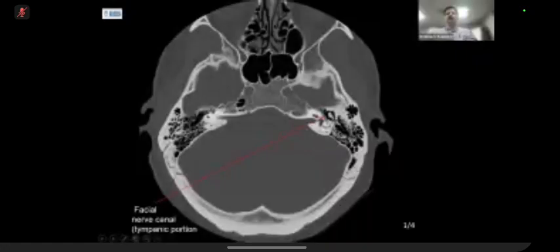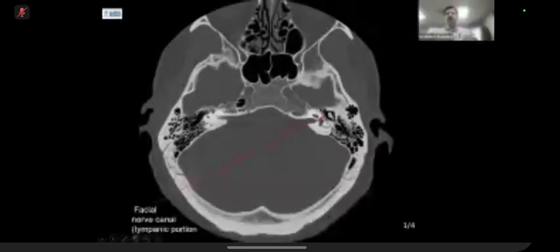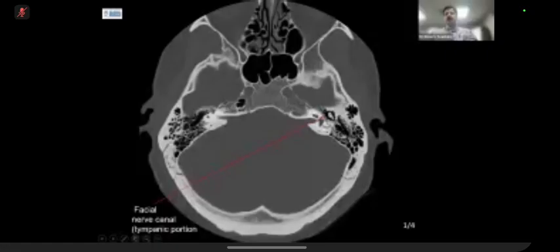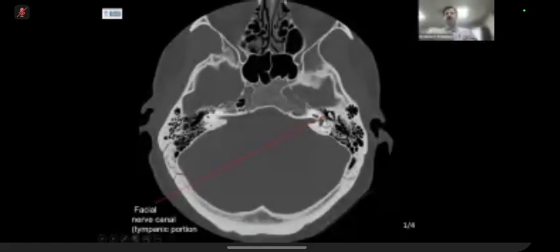Candidate one? Yes, if that's the tympanic part, so no. The tympanic part is this one. There is something else which is just superior to this level. Of course, on an axial slice, you are seeing a bit of partial voluming here. So my question is, let me ask you in different, direct words.